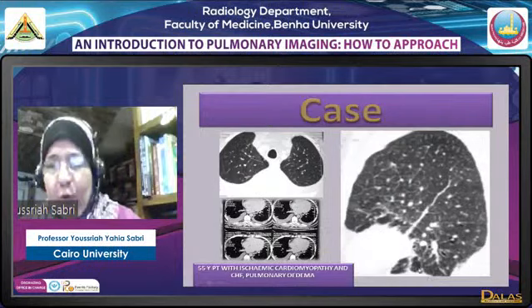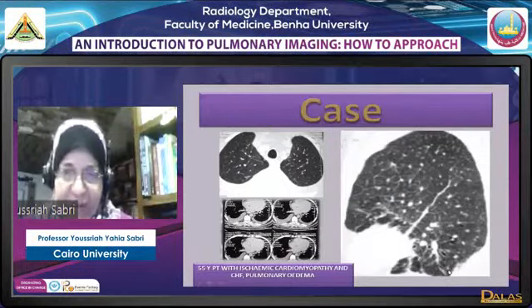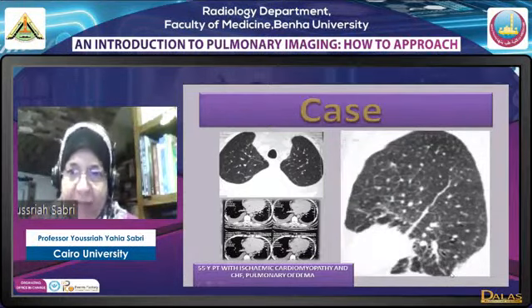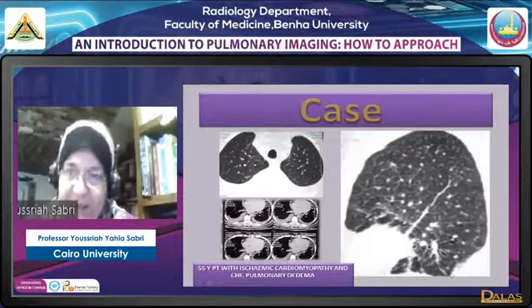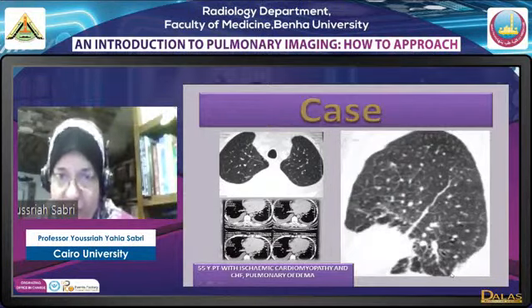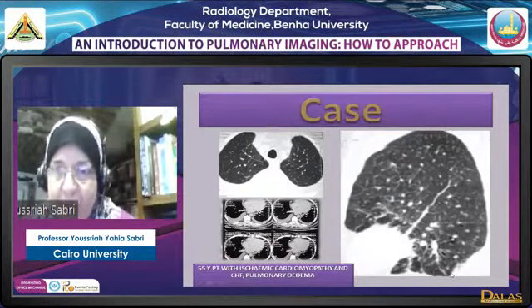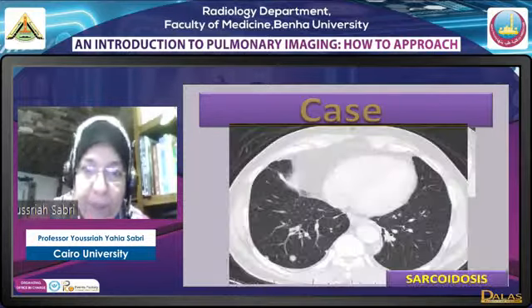Okay, and if you look basally in the sagittal image, those linear structures that you see are prominent interlobular septi. So the prominent interlobular septi here are more basal and more posterior because of the physics of fluid. Fluid will be more basal and more posterior. Interlobular septi here are prominent because of water in the interlobular septa due to edema.